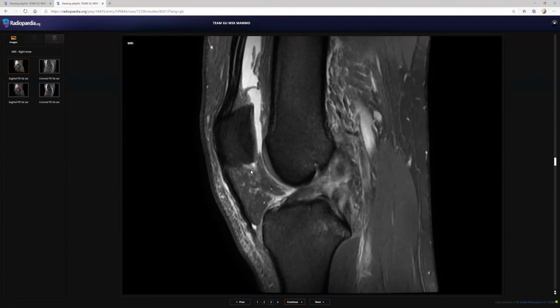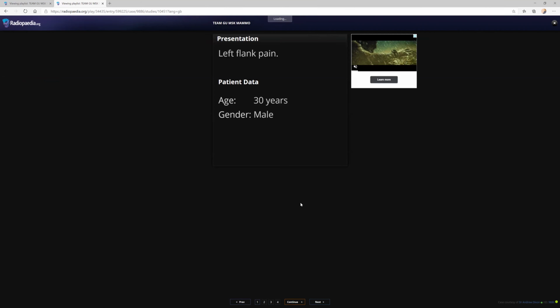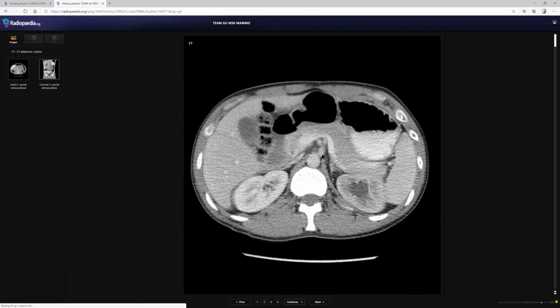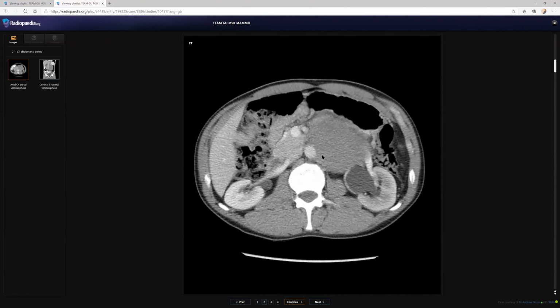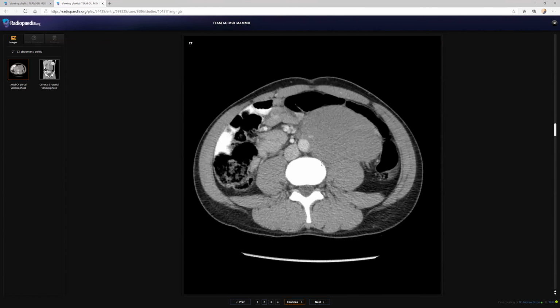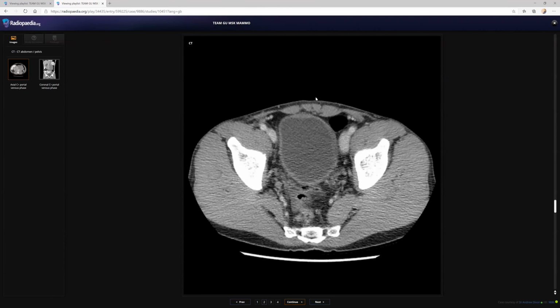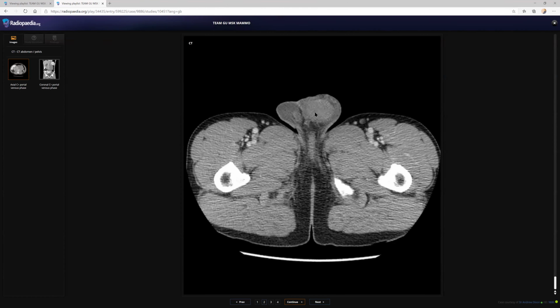So you have to refer this patient to the ortho. That also you told. And this came with the left flank pain. So this is where we are giving the mouse control to you, because if the examiner is calling, then only you will find out the corner of the film findings. It is a corner of the film, a typical FRCR film, where the finding will be at the corner.